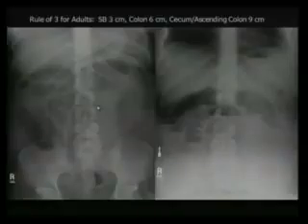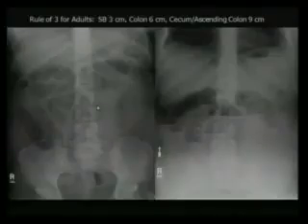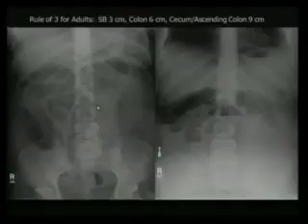If you have a small bowel obstruction, usually there's no or very little gas in the colon. But if it just happened, there will be just as normal gas in the colon as there is. So if you see the entire colon with gas, but you see this, it could very well be an early, complete small bowel obstruction. It just hasn't had time for the colon to clear. Do you see what I'm saying? If the pain has been for a long time, there should be less and less gas in the colon.